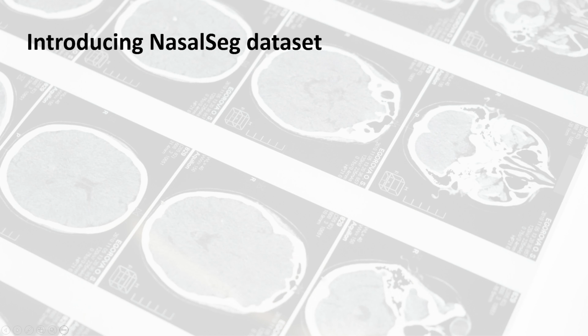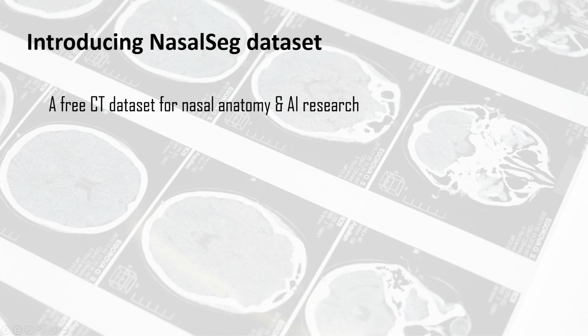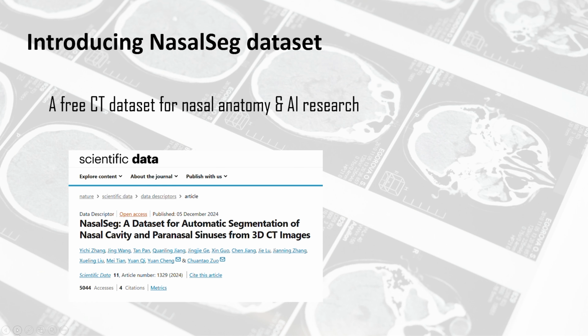project. I want to share a useful dataset that I found while looking for medical imaging data. It's called the NasalSeg Dataset, and it's a full collection of CT scans of the nose and sinuses, all fully labeled by experts. This dataset can be very useful if you're working on AI-based segmentation, anatomy studies, or even surgical planning tools. It's completely free and open to use, which is great. So, let me walk you through what it is, where to get it, and how to actually use it.